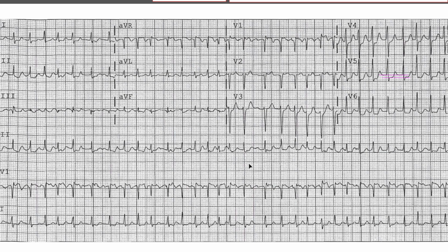So here I'm just kind of gauging this. I don't know anything about this person. I don't know who this came from. Somebody sent this to me. So I'm just going through the ECG. But I'm assuming if this indeed is atrial fibrillation, this is probably not a younger person. It's difficult to see atrial fibrillation in somebody that's 20 years old. I have seen it, but it is extremely rare.